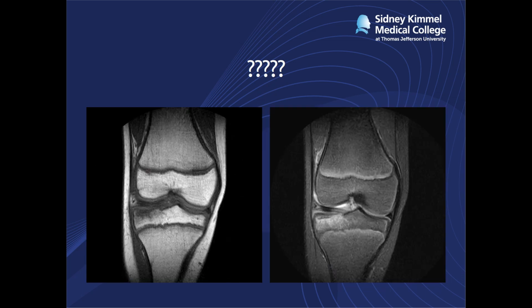And in fact, as we go on, this patient actually had, the real injury was a little subchondral fracture of the lateral tibial plateau. This is a nice example because in this case, this injury should heal without complication, whereas an osteochondral lesion may progress, warrant further imaging, or maybe even intervention. So it's important to recognize this little variation and label it appropriately to avoid confusion later on.